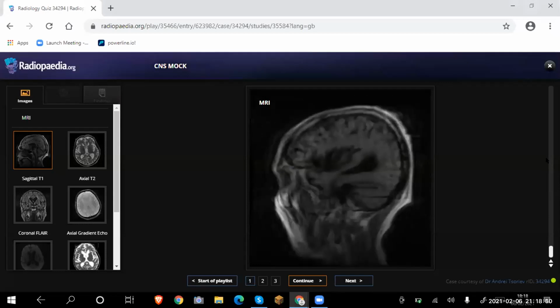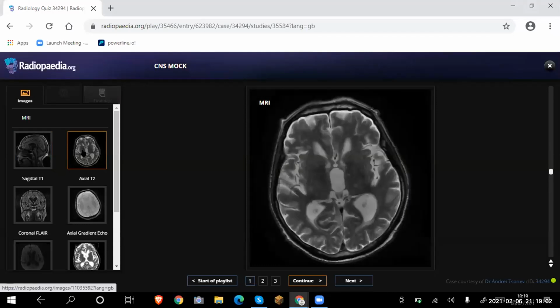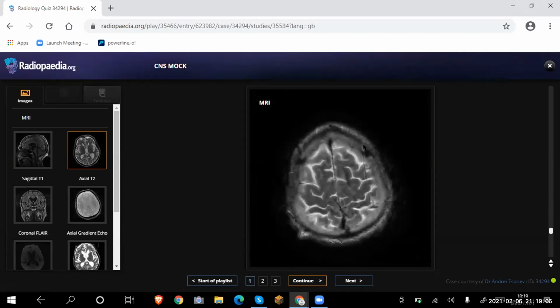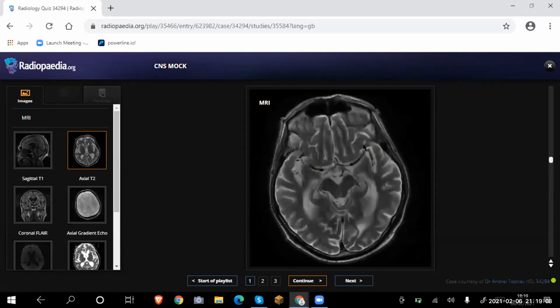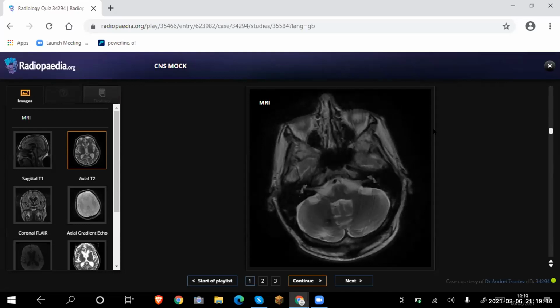Well, you didn't give me any history about this patient. Yeah, I did that on purpose. Okay, thank you. So can I start first of all from T2? Maybe it will be more helpful. Yes, that's fine. Well, these are selected images of T2 weighted MR sequences. I'm starting from above, from the vertex downward, and it's going quickly.